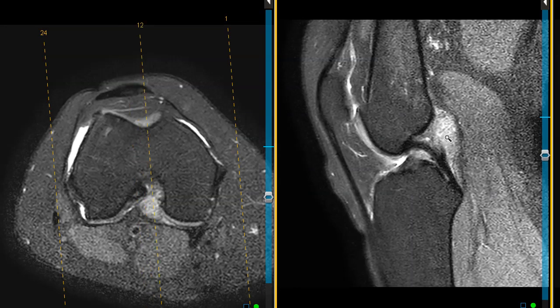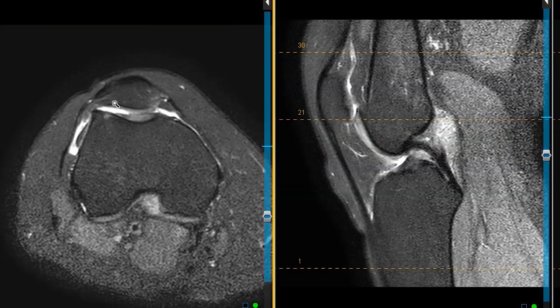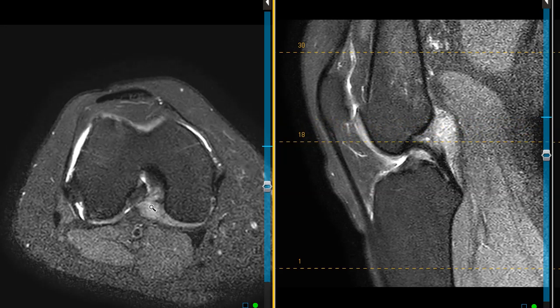This will cause fullness in the knee and knee pain. In this patient, it is unclear whether her symptoms are related to this patellofemoral disease, with the erosion and some reactive fluid. That is probably the main thing, but this definitely may contribute to some of her symptoms.